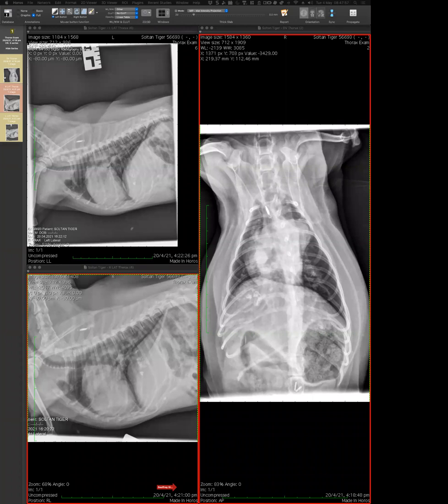So what was the surgery that it had? I don't totally know. It had its kidney removed. It had a renal sarcoma in the past. It's the world's most unluckiest dog. Cool, it makes sense. I thought it was adrenal, but it was just in the area.